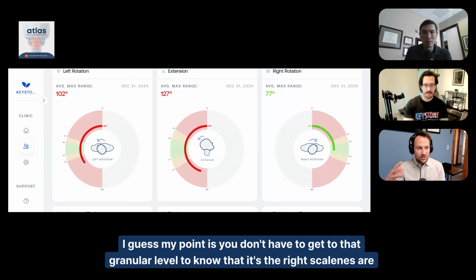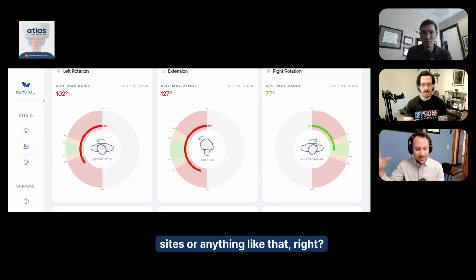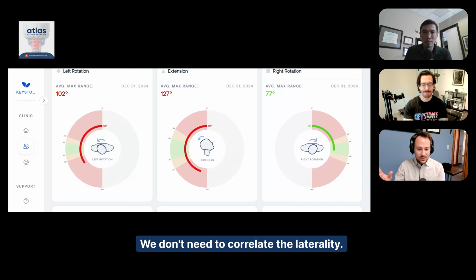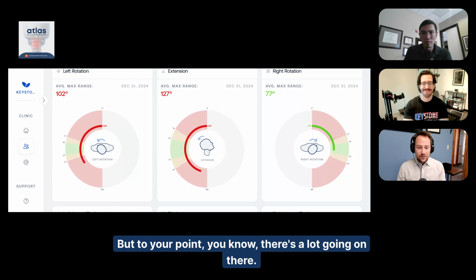I guess my point is you don't have to get to that granular level to know that the right scalenes are sending improper mechanoreception, which must mean that there's a listing associated with these attachment sites or anything like that, right? We don't need to correlate the laterality. We don't need to get too weird about it. But to your point, there's a lot going on there.